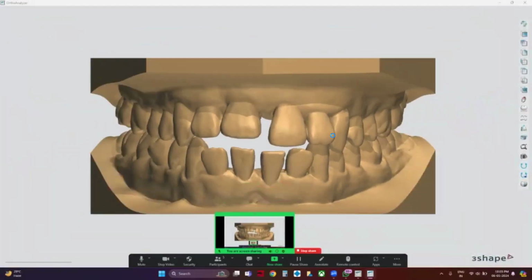I have just done the planning. I've sent it to you, and then I put attachments, and again I sent it to you. So I've sent it to you 2 times. Okay. So let's check which one has come right now.